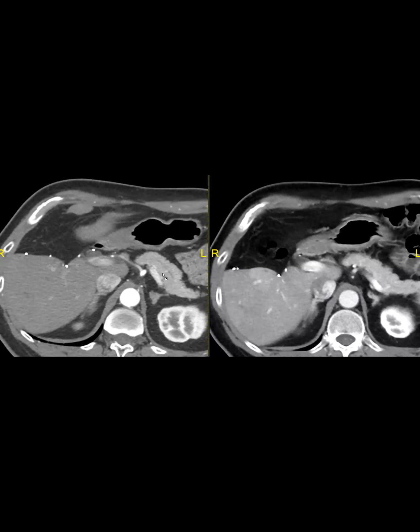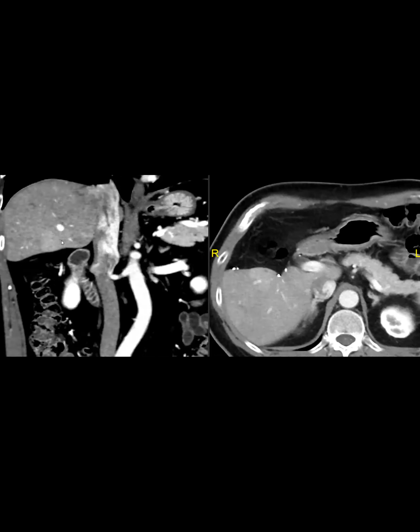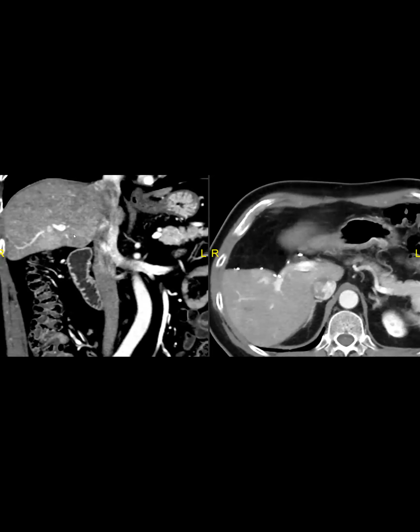It can be both, right? Generally we think about it as a rim, but here, this one is a big thing. There's no rule as to what corona is, but this perilesional enhancement in arterial phase is actually not a great prognostic factor. To me, that geographic subcapsular stuff is that shunting that Aarti described before that we see with tumors around.